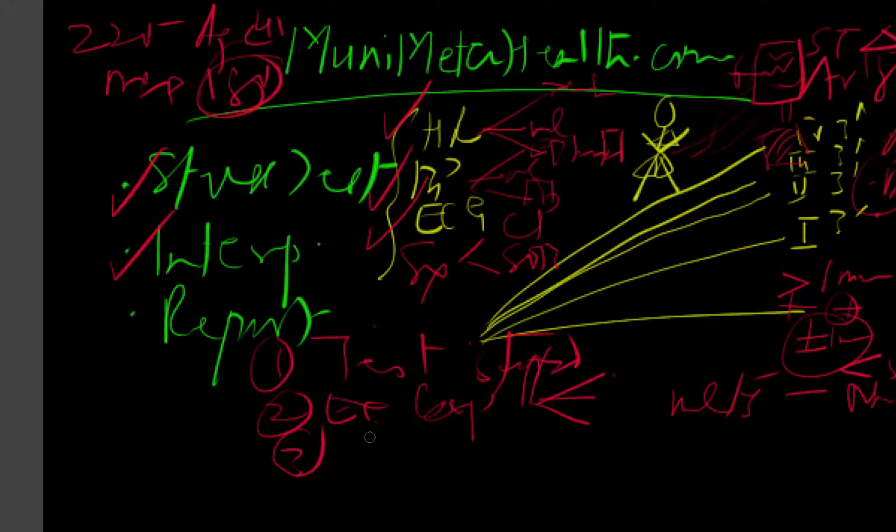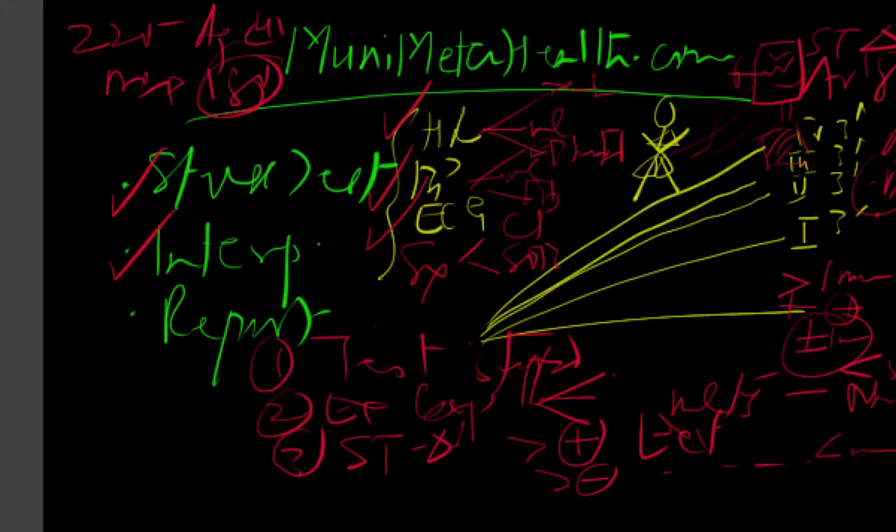Thirdly, you'll define what the ST-T changes are on the EKG. Now, if ST changes are more than 1 millimeter, like I said, then you say it's positive for exercise-induced ischemia, okay? Because that's what you did. You tried to induce ischemia by exercise, not by anything else, by exercise. So say positive for exercise-induced ischemia, or you'll say it's negative for exercise-induced ischemia if there was less than 1 millimeter change noticed on any of the leads, or the changes did not occur at all.